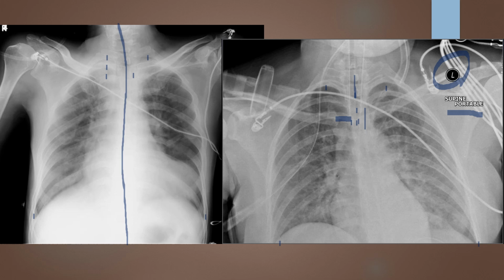When I look at my mid-coronal tilt, here I'm going to first go right up to the apexes and evaluate the distance between the apex and the clavicle. This looks significantly over an inch, so that would tell me that one of two things is wrong. Either my patient is tilted anteriorly, or my central ray angulation is directed too far caudally, throwing those clavicles inferior in the image.